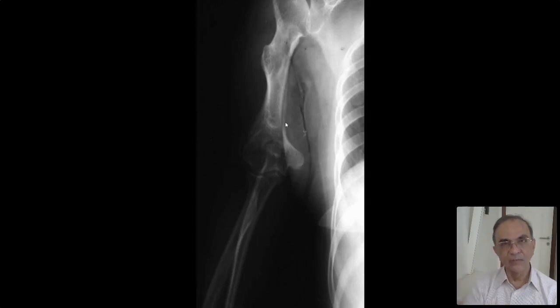You don't have to see 100 bones to make a diagnosis of diaphyseal aclasis, because there is a deformity of the formation of the whole bone along with the osteochondroma. Why am I saying this again and again? Because people fail to pick this up as an osteochondroma. Simple rule: anything that grows out of bone is an osteochondroma. Then you decide whether it's syndromic or not. Now, this is a real homework for all of you.